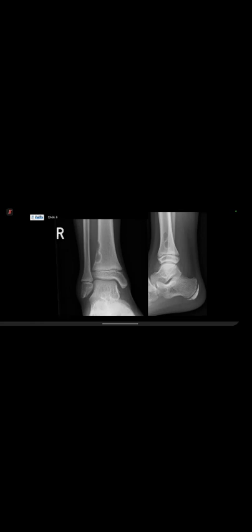So we'll come on to osteoid osteomas later. But you nicely described the non-ossifying fibroma in this distal tibial metaphysis. They tend to be long lesions, eccentrically placed. And this is a nice example of what's described as a bubbly lucent lesion. They tend to have that sclerotic margin. There's no periosteal reaction or really aggressive features associated with the lesion, as you really well described.